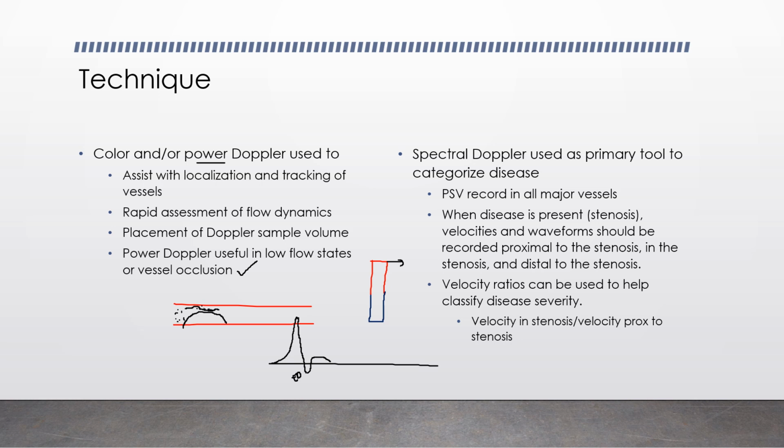Now, let's say my patient got on the treadmill and ran for 2 hours. Now, those muscles are pumping, their metabolic needs have increased significantly, and you're going to see a lot lower resistance waveform where those muscles are saying, give me blood at all times. I'm not going to push back on you at all.